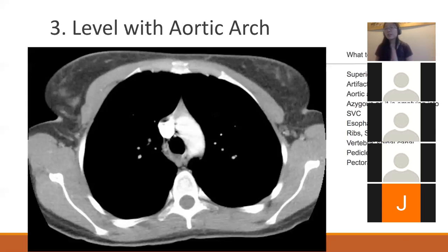And one reason why this vein is so clinically significant is because it represents an, I don't even know how to say this word, anastomosis from the superior vena cava to the inferior vena cava, because it runs the whole length of the right side of your body, from here all the way down to your IVC. That's really important because if you have a blockage in your IVC region, this is a clinical correlation from your iBook, then your body can use the azygous vein as another accessory pathway to get into your superior vena cava. So that's the azygous vein.